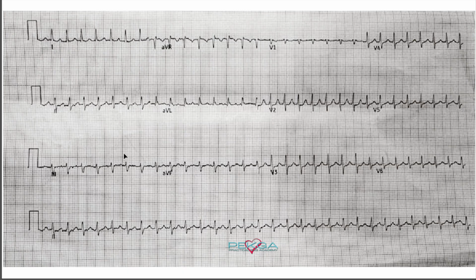So going back to the 12 lead, the first thing that stands out, the characteristic of this ECG that's really up in my face, is the rate. The rate is so fast. Now this particular ECG, we don't have a lot of demographic information on here.